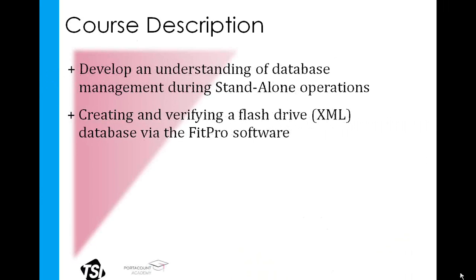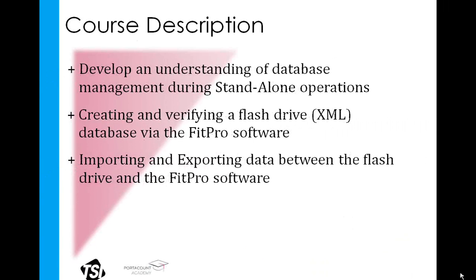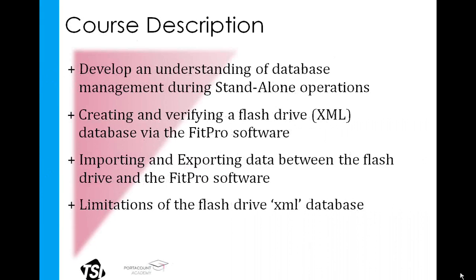During this course, we're going to discuss various aspects of database management during standalone operations. That's going to include using the FitPro Software's import and export function, as well as creating and verifying operations of a flash drive database. And we're also going to briefly discuss the file size limitation associated with the flash drive database.